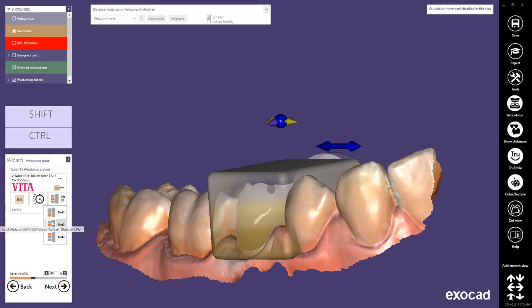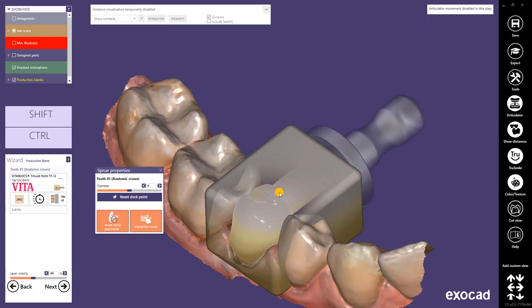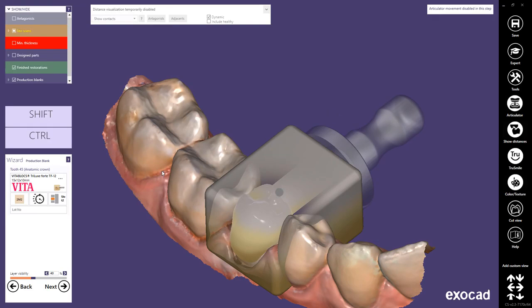You can change the properties of the sprue by selecting the ellipsis. If possible, avoid placement of the sprue in cavity by selecting Avoid Cavity Placement. Add a lot number for the production into this field. Note: depending on the reseller configuration, this field may be mandatory.